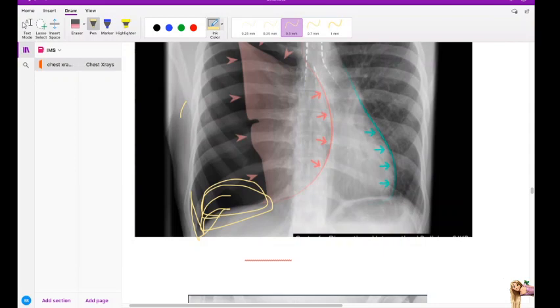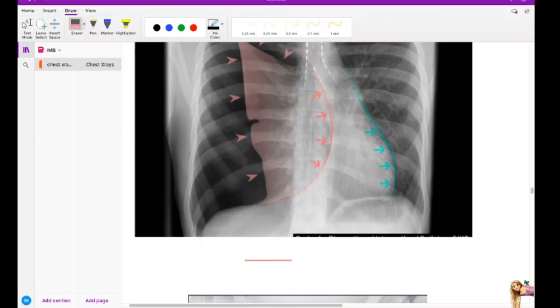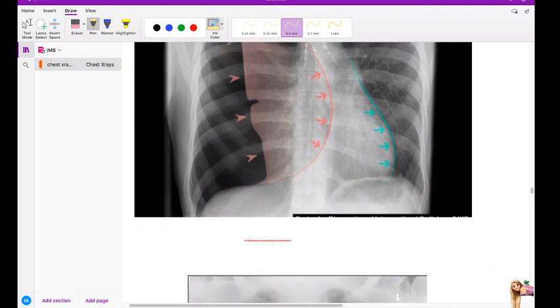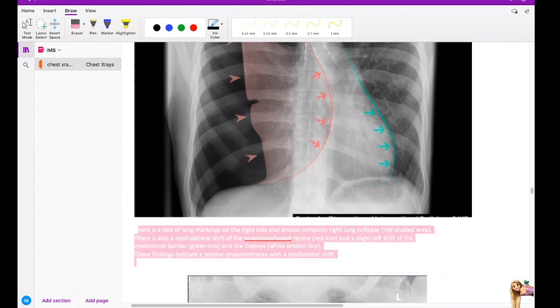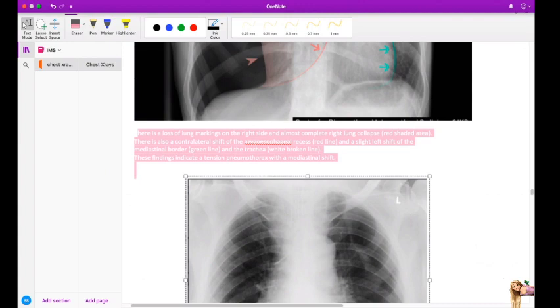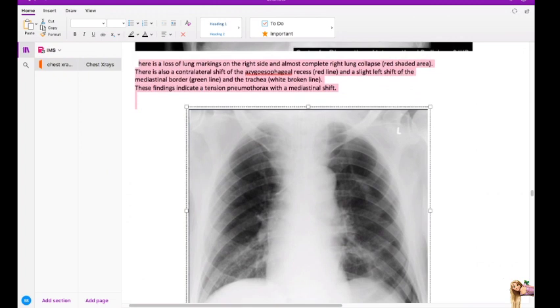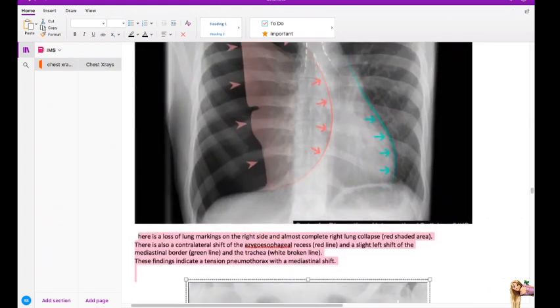How are you going to differentiate between sulcus sign and? I will show you. There's an X-ray that will come. Okay, so this is this. Yeah, you can. It can either be shriveled up or it can just be whitened. It can be either of those. We'll see.